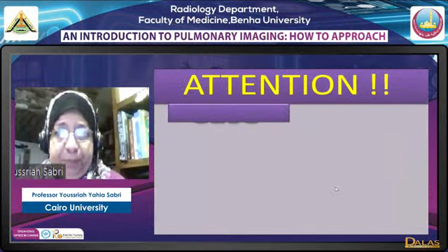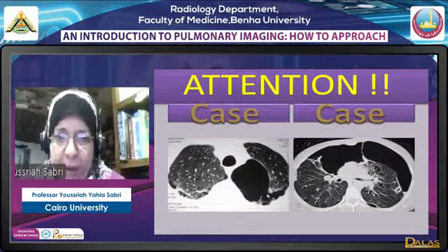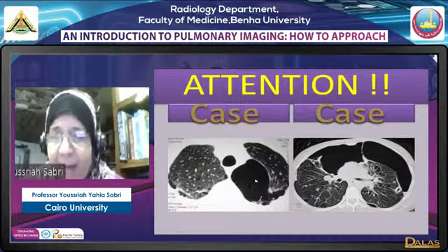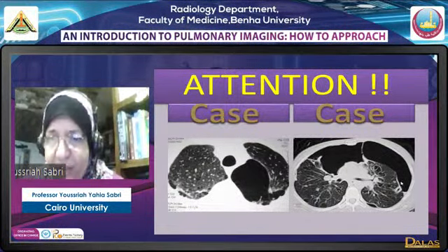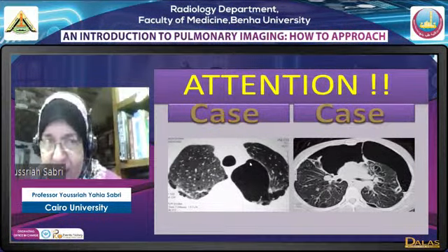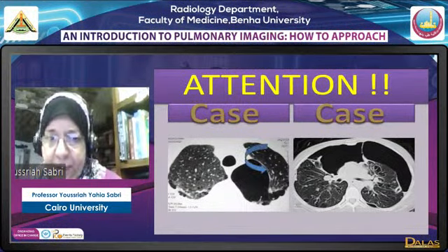Now here, this is a bulla, and this is pneumothorax. See the bulla, you see it actually as a black mass, while pneumothorax will displace the lung as it is. It only displaces the lung. It does not indent it as the bulla does. Okay?